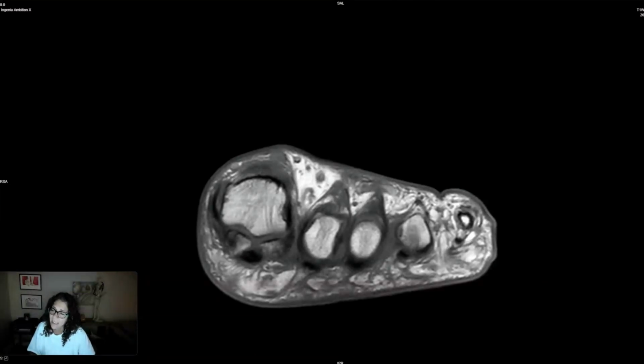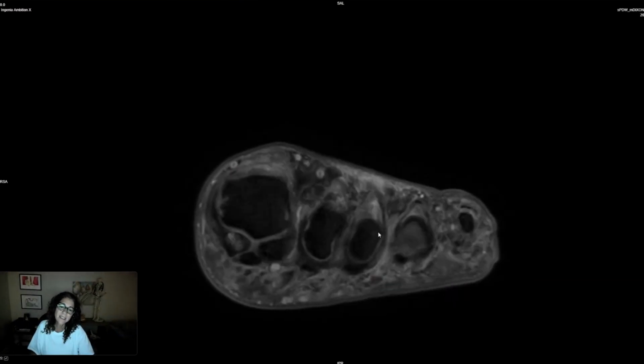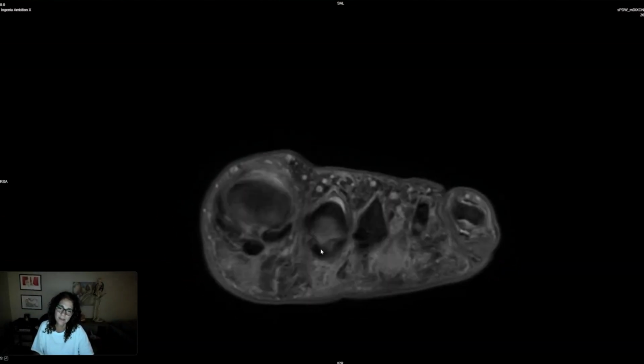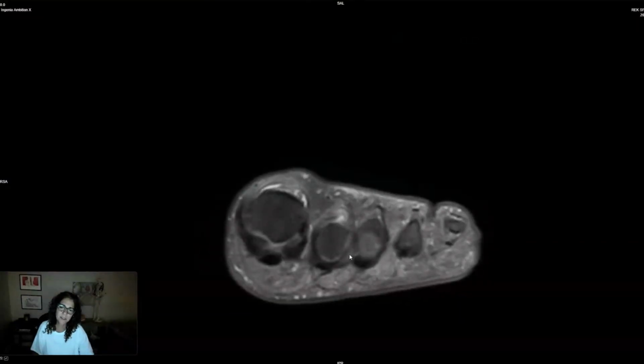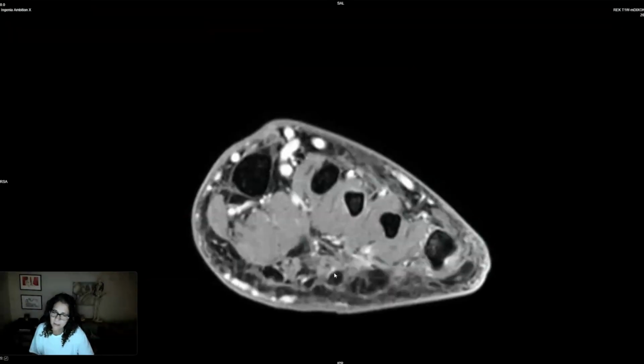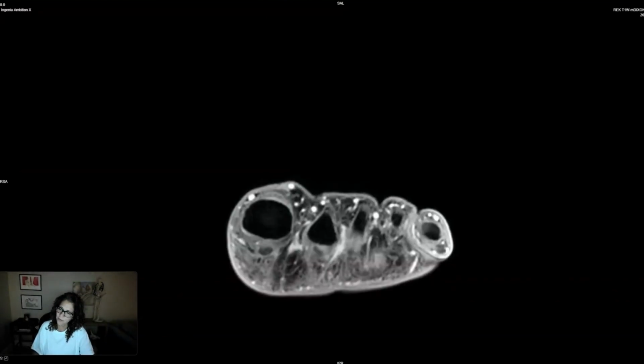Let's take a look at how much stress. Let's take a look at the Dixons and see. So what I'm seeing is that all the plantar capsules are kind of indistinct, stretched, and thickened. And when I'm looking for tears, this is not sharp. Let me see where else I go. So a lot of blurry imaging in this area here, but I'm looking for a plantar plate tear. And I'm thinking about, let's see, going back to this guy here. There's a lot of magic angle that I feel goes on with this.